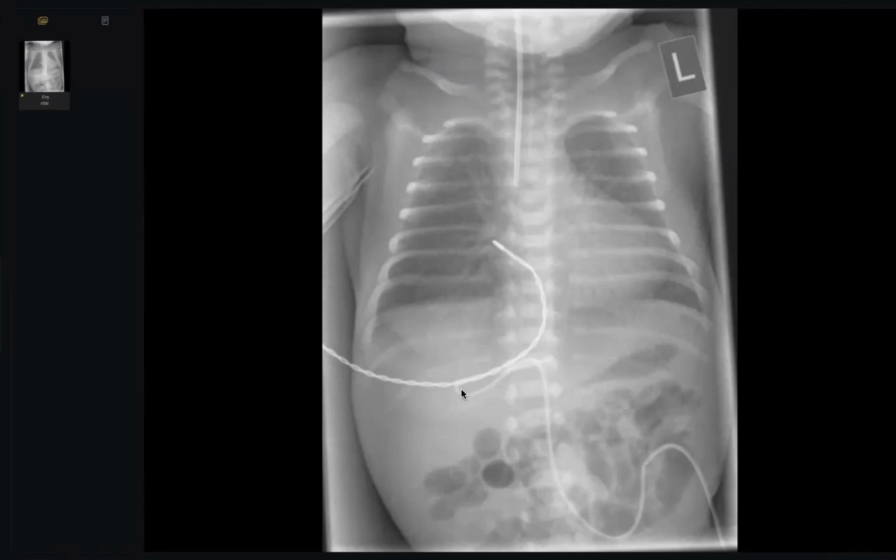hepatic arteries? See, a portal vein or hepatic arteries will be like this, at 45 degrees with the vertebral column. But what structure here has a direct branch from the aorta to the right and to the left? Mesenteric vessel, renal artery. Renal artery, or maybe superior mesenteric, no problem. Go on.